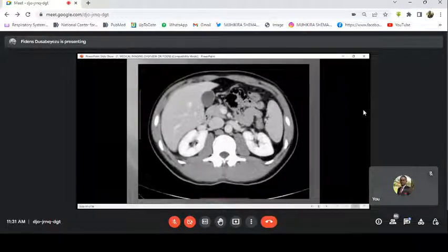Axial. Yes, this is an axial view. Can you differentiate now? You see how CT scan is very good. Conventional X-ray cannot produce this kind of image. This is one slice, by the way. This is one cut at the level of the kidneys and the liver.